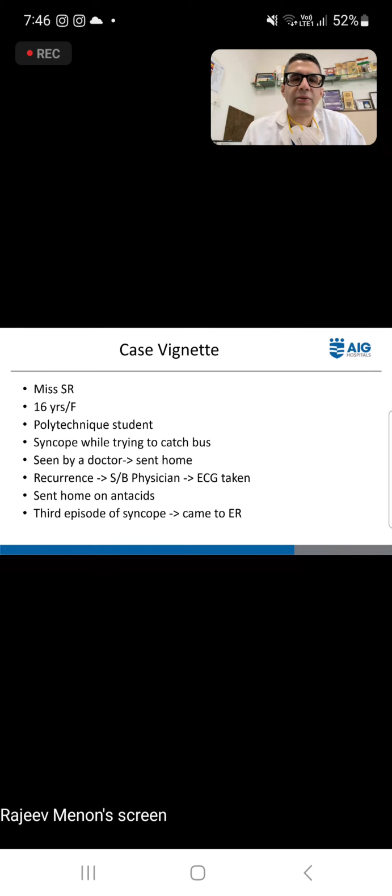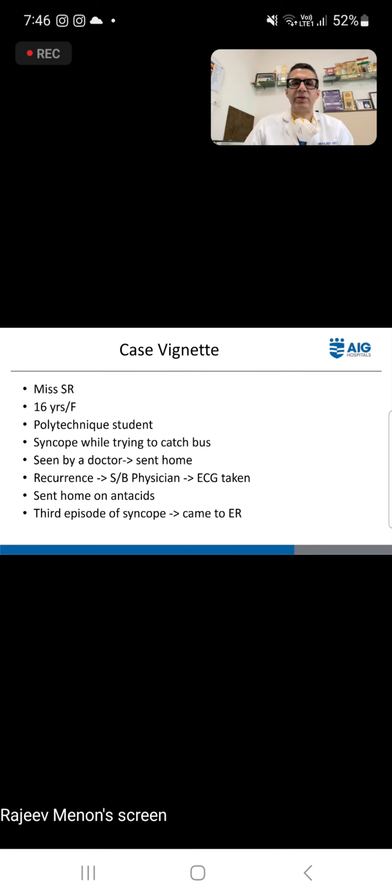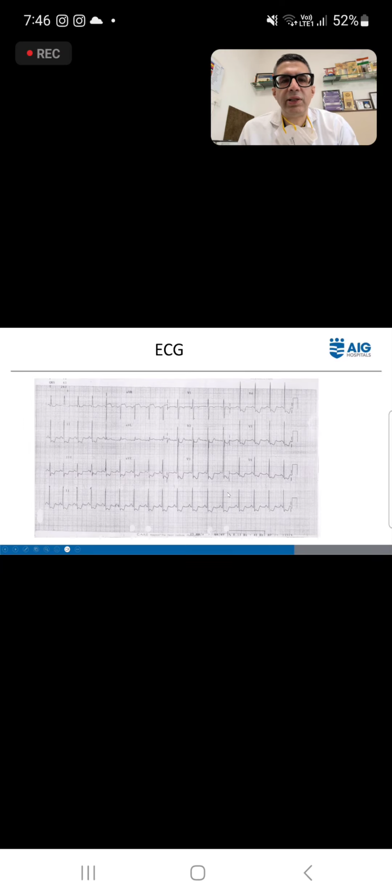She developed a syncope. She was seen by a physician. An ECG was taken. He said the ECG shows some changes, but non-specific changes for a lady, so he gave her some antacids and sent her back home. Then she had a third episode of syncope when she came to the emergency. So we took an ECG in the emergency, and this was her ECG.